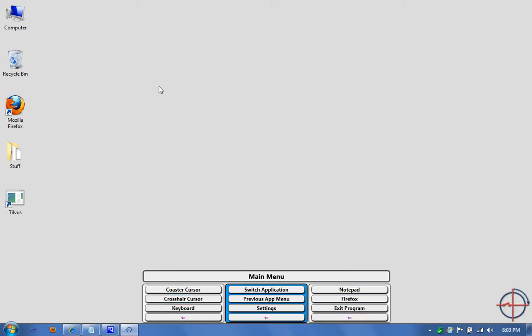So as you can see, our main menu works like most other menus. You will see scanning across different groups of options, and pressing the button will take you into that group and scan you through the options within that group.